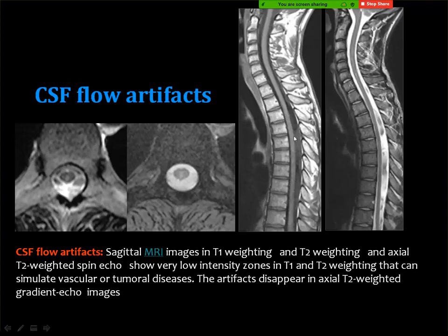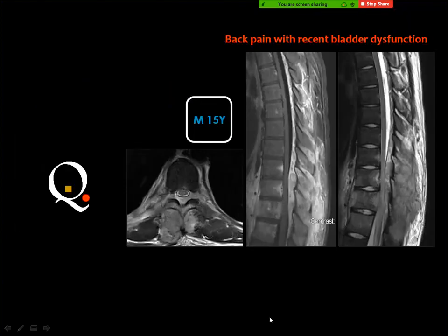They can be seen in the T1 and also in the T2 weighted image, but they are clearly identified in the T2 weighted image. Sometimes if you change the pulse sequence, these artifacts will disappear. But many times I see that these patients were mistakenly interpreted as dural vascular malformation, and they are recommended for contrast studies and so on. But these are artifacts.